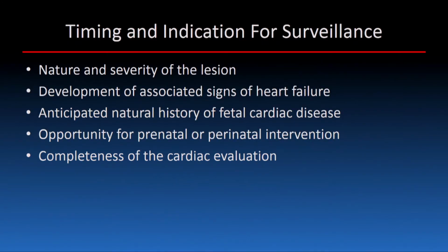Now, there are various reasons for performing repeat fetal echocardiography throughout gestation. First of all, it helps us understand the nature and the severity of the lesion, and development of signs of heart failure can be detected as well. It gives us a way to track the natural history anticipated of each fetal cardiac lesion, and the opportunity for prenatal intervention, even planning for perinatal intervention if needed. And then finally, as we've all experienced, during one scan, the fetus may be in a challenging position, and a repeat evaluation may help us really complete that cardiac evaluation.